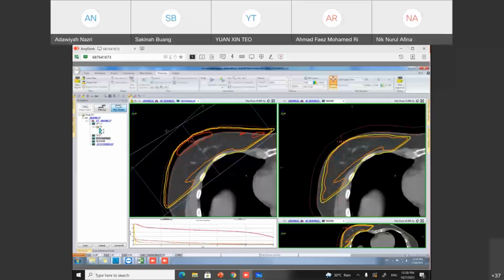So in the usual plan, at 1.6 cm depth from the bolus, this point actually gets 100%. I can show you the difference, but can you understand now? Otherwise I will show you the max point for the bolus.